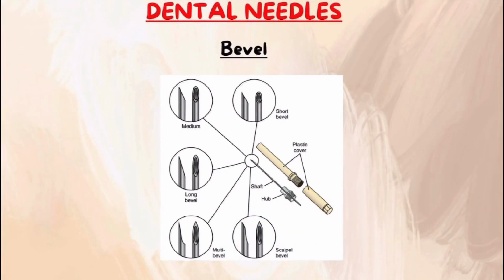One important thing to note is the angle of the bevel. This is the long axis of the needle and this is the angle of the bevel.